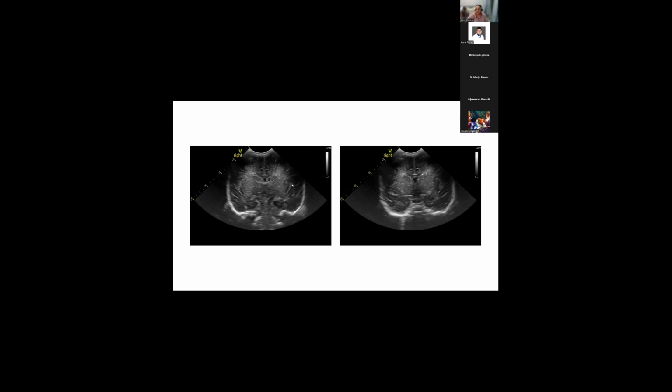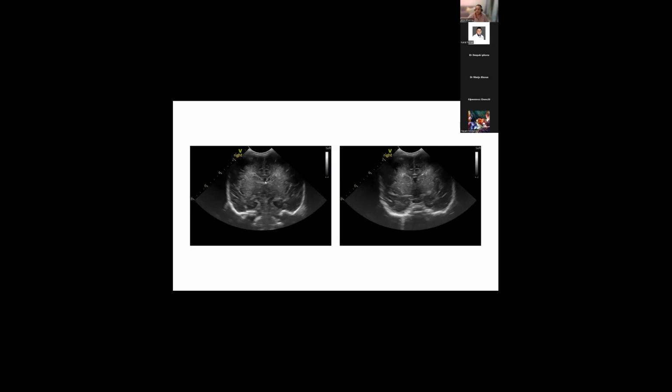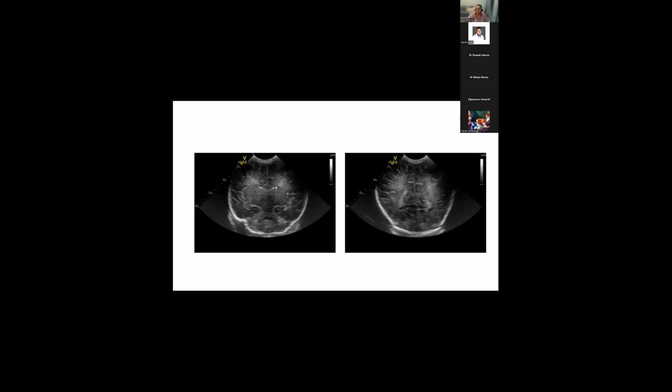You can also see the lateral fissure, as some people call it, or the Sylvian fissure. Sylvian fissure, yeah, as a Y coming through over here. And this is the image just before it, just for comparison. But then I go into what is called the trident view. In the trident view, the cavum septum pellucidum and the third ventricle have disappeared. What you've got is the lateral ventricles, again a little bit of the Sylvian fissure on the lateral side, and you can see some choroid plexus starting to appear.